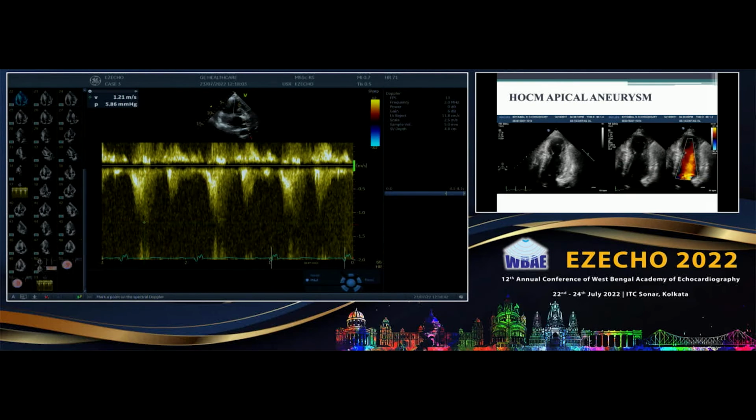Yeah, because this is very important that this point is raised, the subvalvular apparatus of the mitral. See, what has happened is, as residents, we are always taught that there is a Venturi effect, but that is all nonsense. What actually happens is that the subvalvular papillary muscles are rotated in an anti-clockwise direction. Okay, so generally what happens is that your LV inflow and outflow are perfectly different in the LV cavity.